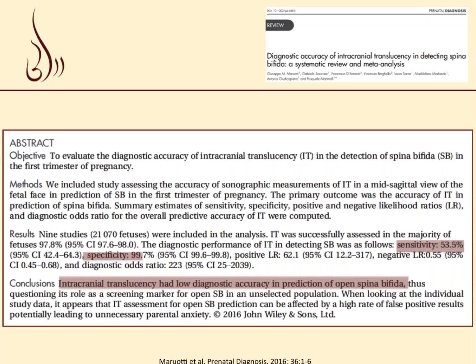So it is very important not to raise concern and alarm to families early on. The recommendation would be, when you obtain this midsagittal view, to take a look at the posterior fossa, to look at this area. If you are suspicious, do a transvaginal scan, or bring the patient back in a couple of weeks to confirm the diagnosis.